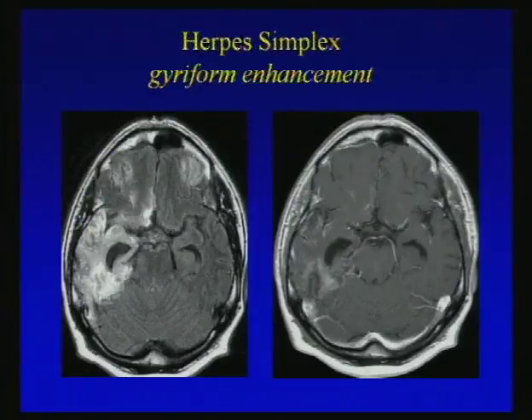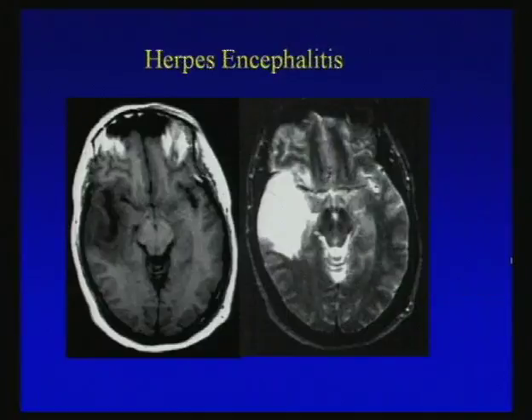And on post-contrast images, again, we see some ill-defined enhancement, evidence of active encephalitis. And in this case, we see chronic encephalomalacia. This is the cavitary, chronic form that we're imaging this patient months or years out after encephalitis.